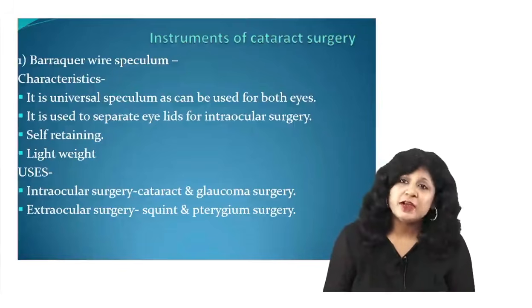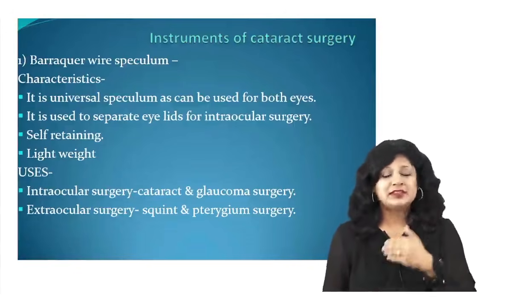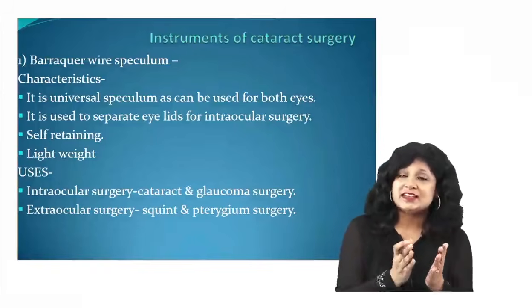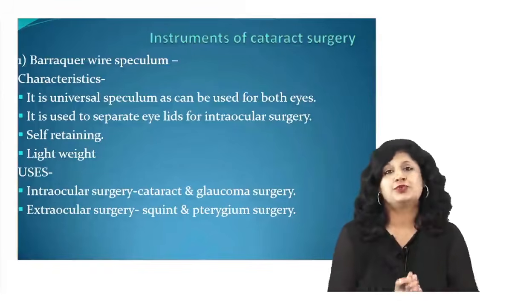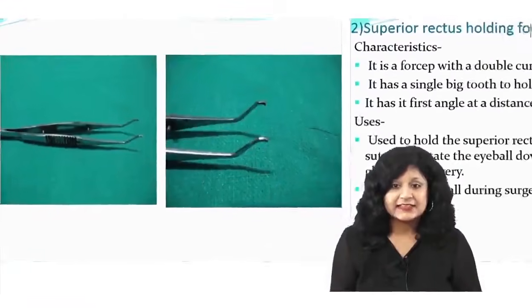Whenever you are doing any intraocular or extraocular surgeries, you require this speculum. That is the reason I started with this, because the moment you are into the procedures, whether it's in the OPD or in the OT, you have to know this. Alright, so this was your first one. Now let's see the second one.